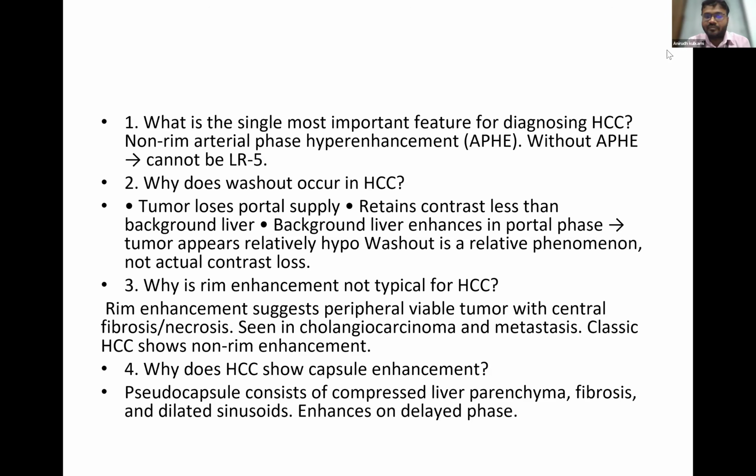Very important. Why does washout occur in HCC? That is why there is a washout. So washout is a phenomenon relative to the liver.